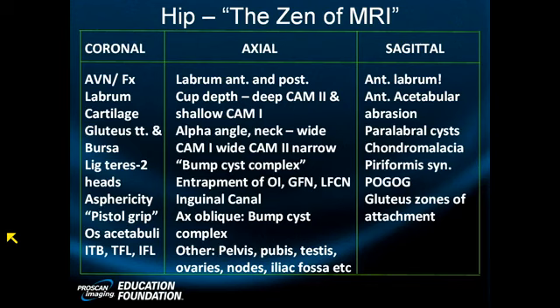Let's go back and look at the alpha angle of this patient. The patient does have a bump at the neck, don't they? Shall we measure it? I don't like to measure things, but unfortunately, I get asked to do this a lot, so I've gotten pretty quick at it. If I can just find the measuring tool. Here it is. There we go.